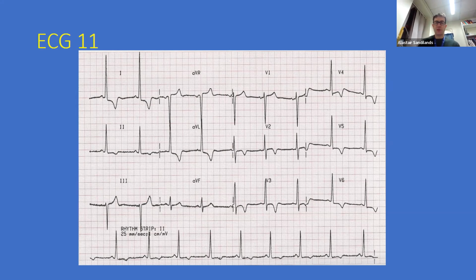Okay, so if you go through the ECG, we're trying to look for ST-T wave changes. So we've got deep T wave inversion here, and a very big R wave in AVL, with T wave inversion in V2, V3, V4, V5, V6. There's a big R wave, but not too much, probably in V5 and V6.